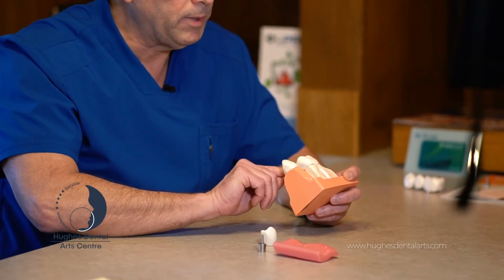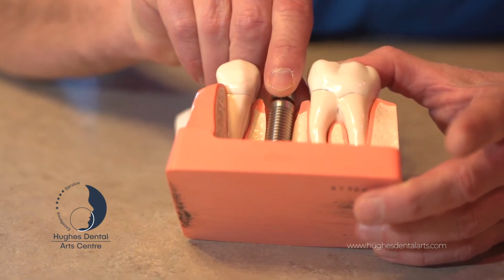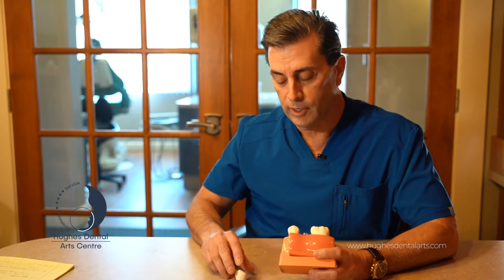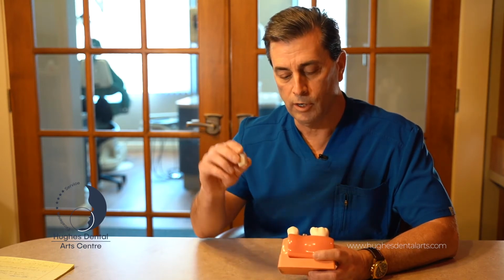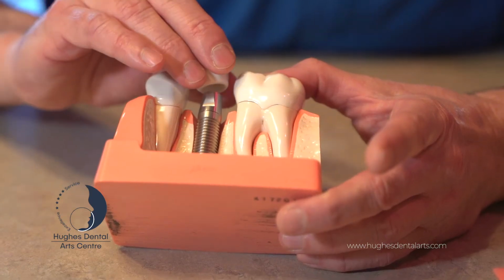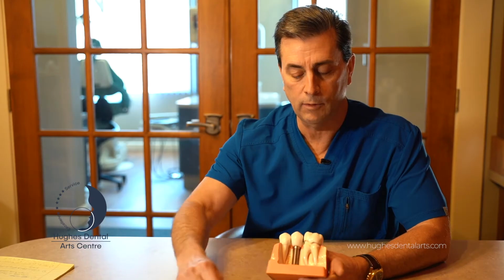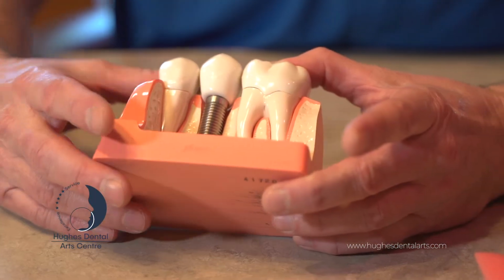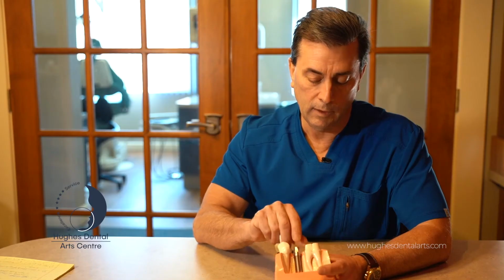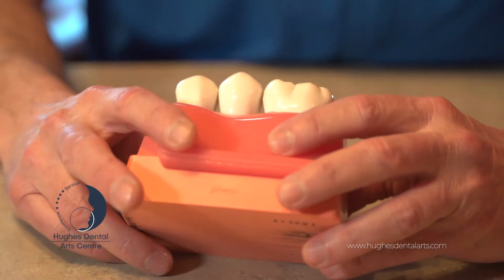After the dental implant goes into the bone, then what's put in is called an abutment. Some people call it a post, because we need something for the crown, which goes on the abutment, to hold on to. So this is the crown that's made afterwards, and it goes onto the post like that. The dental implant really is a series of things that are used. Number one, it's just the replacement root, and then the abutment, and then the crown. That's what a dental implant actually is, okay?